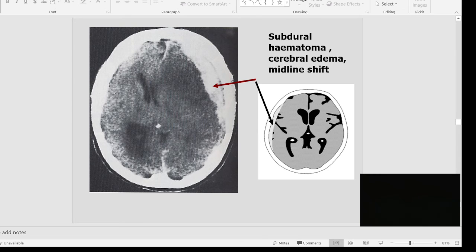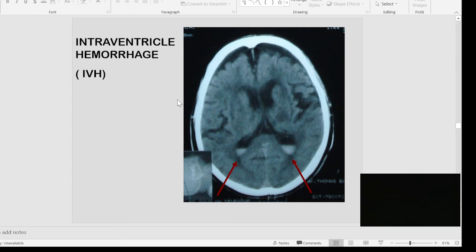May image na siya, no? We have here intraventricular hemorrhage, so IVH. Pasabot intraventricular, that is within the ventricles. So makita nimo siya. Look at here, this is the ventricles. So what happens to the appearance of the ventricles?